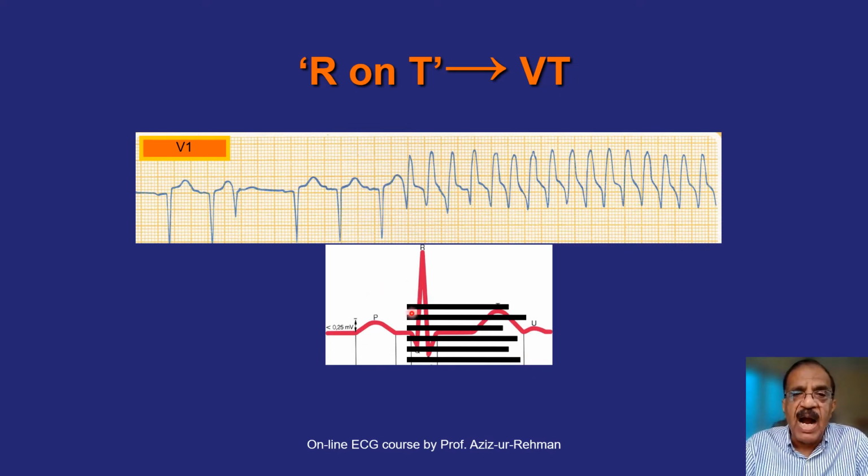This is because different myocytes have different sizes. This process starts together, but the portion of the ECG which corresponds to the downslope of the T wave is where the repolarization ends and the refractoriness ends. So there is differentiation. Some myocytes have recovered. These bars indicate refractoriness. At this point, for example, this muscle has recovered and this one has not. At this point, this muscle has recovered and this one has not. And this would predispose to R on T.